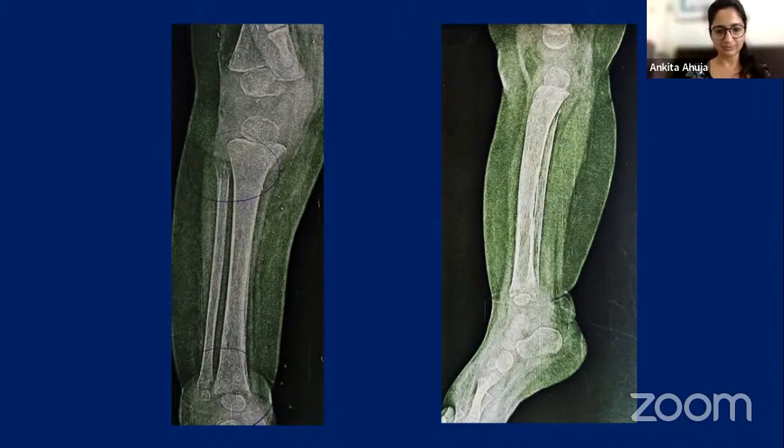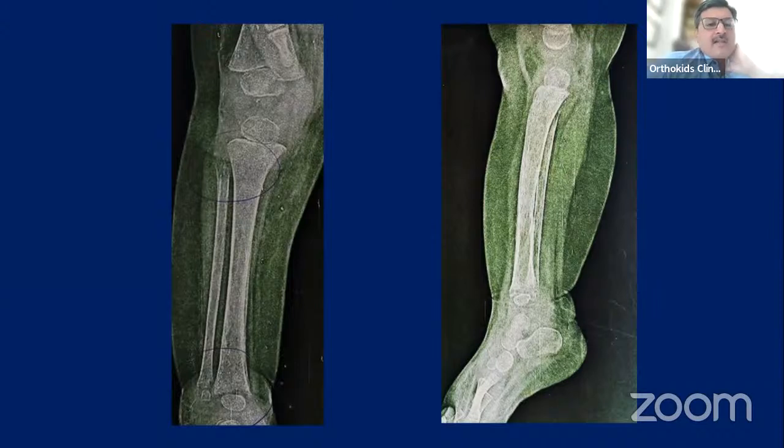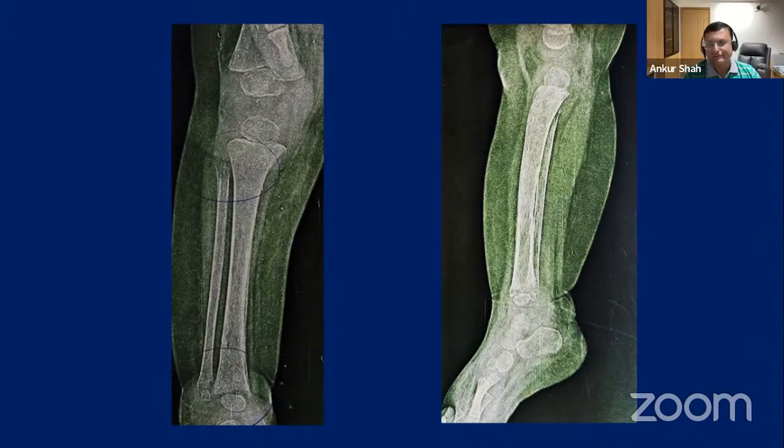Similar periosteal reaction also along the tibia. Yeah, there is a bit of medial periosteal reaction, agree. There's some periosteal reaction proximal fibula as well. But the only odd thing is the distal end of femur looks fine. It doesn't show these changes. Yeah, true.